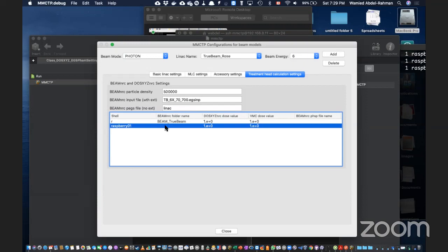Is it possible to calculate the doses for an SSD setup, like in Cobalt 60? You can. I'm struggling with something, but I'm sure we can. It's this physics patient that I'm struggling to create, but we can always generate this, and I can show you.